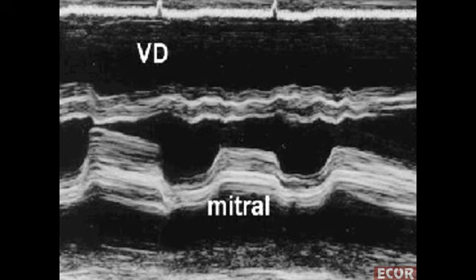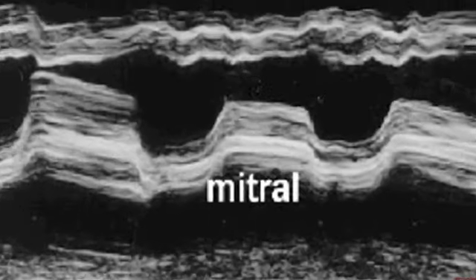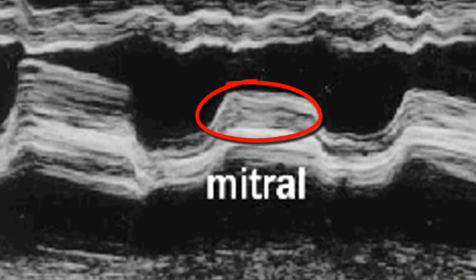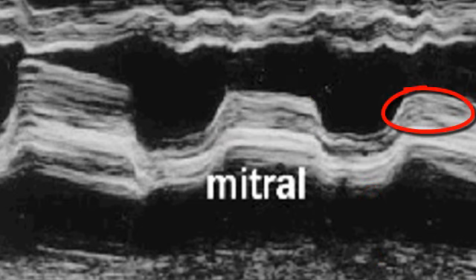Watch this M-mode of a calcified mitral stenosis. There are lines here from calcium, but also regions where you see no perfect lines, but smudge in certain places and also the torn paper sign. So there is endocarditis. These signs have to be searched for with M-mode.